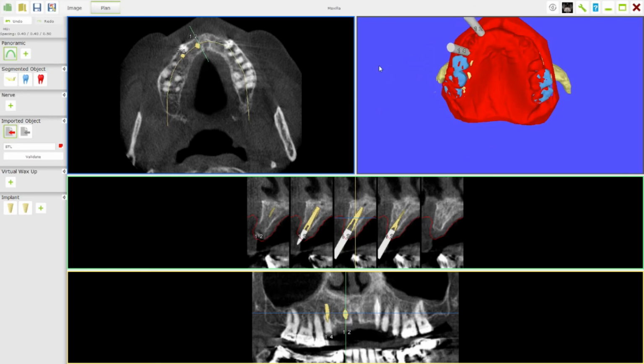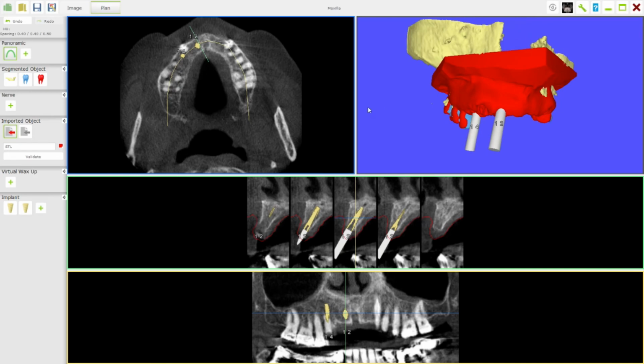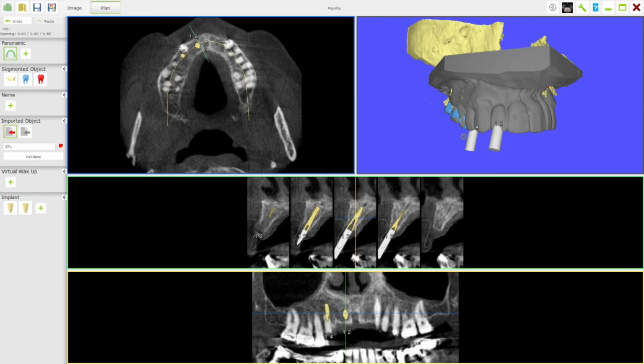So we've now got a model of our gingiva, and then we can pop in there a model here. We can go back, we can switch out the gingiva, we can right click back onto the teeth, and now we have a model of our teeth, and we can click back into there. And because I haven't left clicked, if I right click onto here, the teeth come back in.